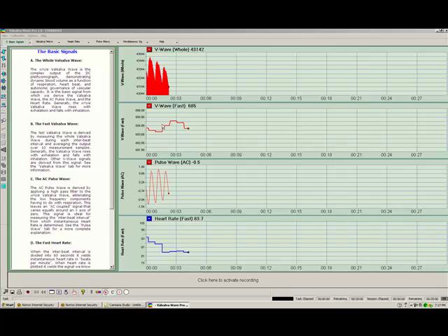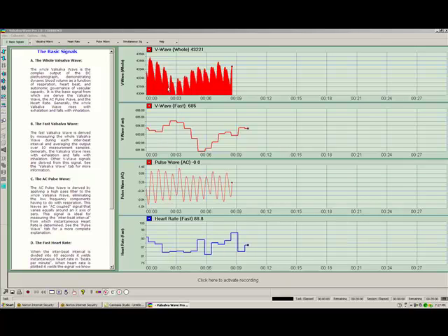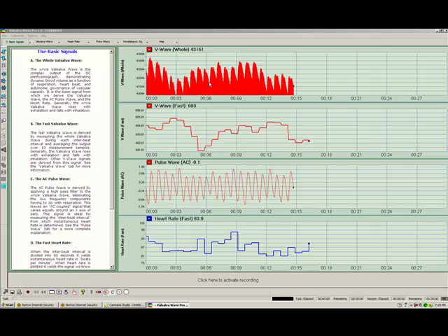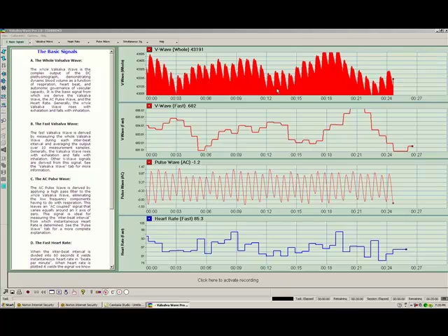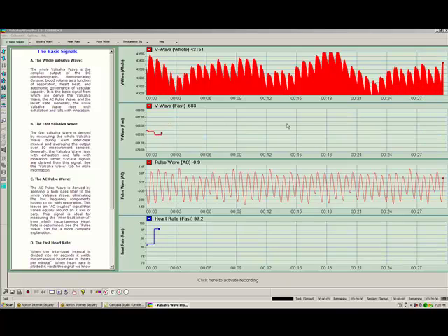Valsalva wave. It is derived from the whole valsalva wave by measuring the blood volume at the interbeat interval at the cardiac diastole, each one of these small valleys. That is measured and plotted, which then forms the fast valsalva wave. There is a slight delay you can see here between processing associated with that and the fast valsalva wave.